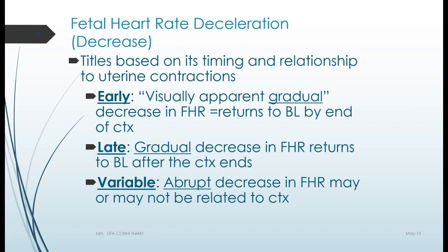An early decel is a visually apparent gradual decrease in the fetal heart rate. See that gradual underlined right there? You can see it. It returns to baseline by the end of the contraction. It starts to decrease about the time the contraction starts.